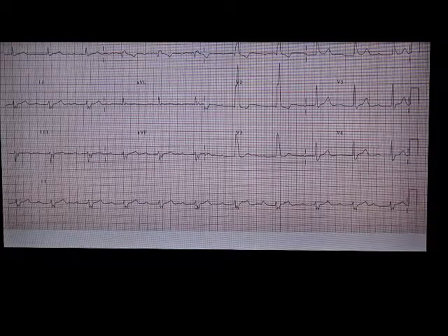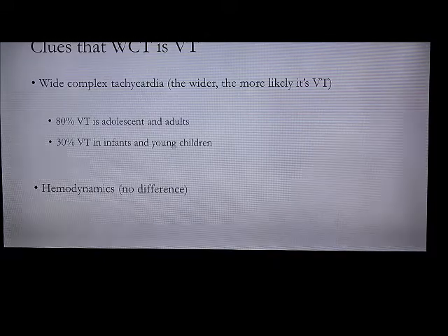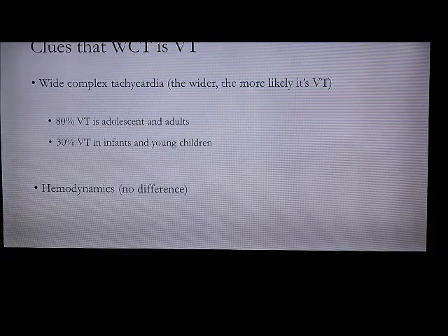The PR interval? First degree heart block. So what do we call this? Trifascicular block. Okay, so how do we differentiate? How do we know? And this wide QRS is actually a ventricular kind of rhythm.